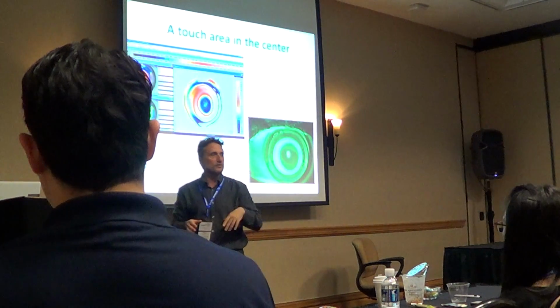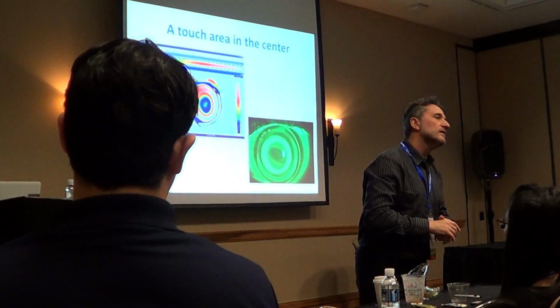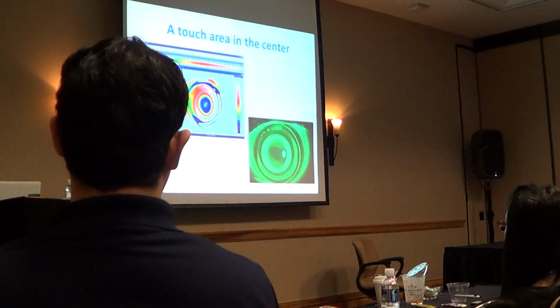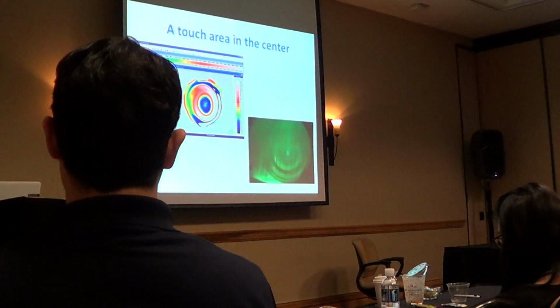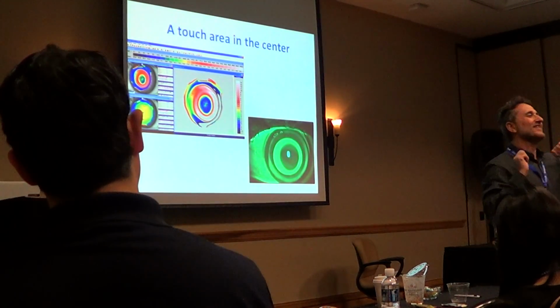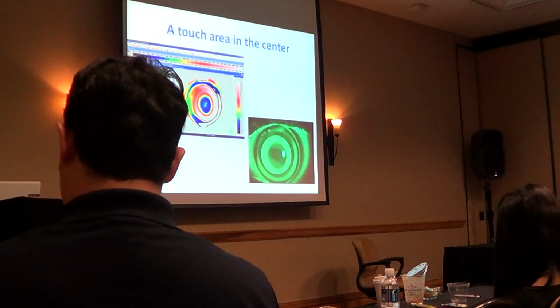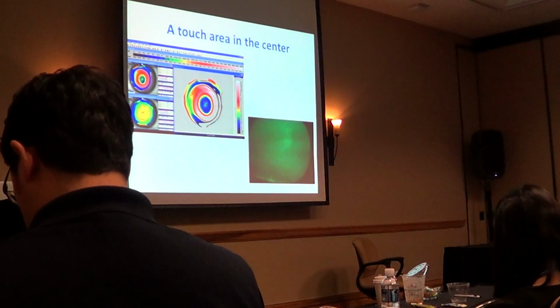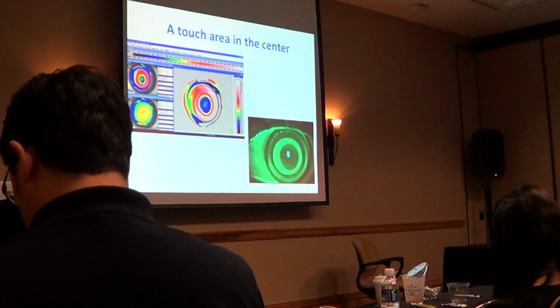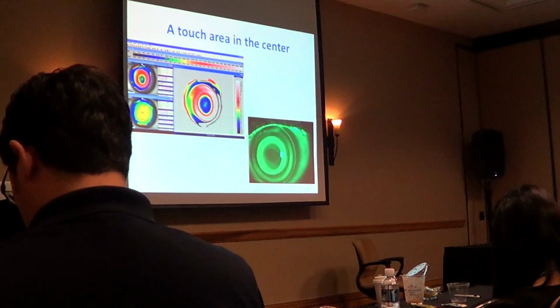Okay, I'm sure. Yes. So this way it is fixed, for what is called a pseudo central island. Sorry? Pseudo, not the real central island. Pseudo. Well, yeah, it's not true. Yeah, exactly. Fake central island. Okay, Jaume created the patterns: smiley face, frowny face, lateral decentration, central island, and fake central island. This is the fake central island, okay?